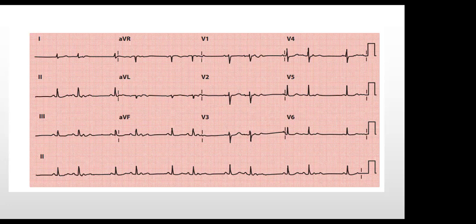However, what I'm not clear about is, after the ectopic beat, after the QRS complex, there is a deflection that looks like a P wave or retrograde P wave. You're looking at the rhythm strip, right? Is it this one you're talking of, or this? Yeah, that's the QRS complex. Then after it. Yeah, this is what you're talking of. Yes, so this is a pause.